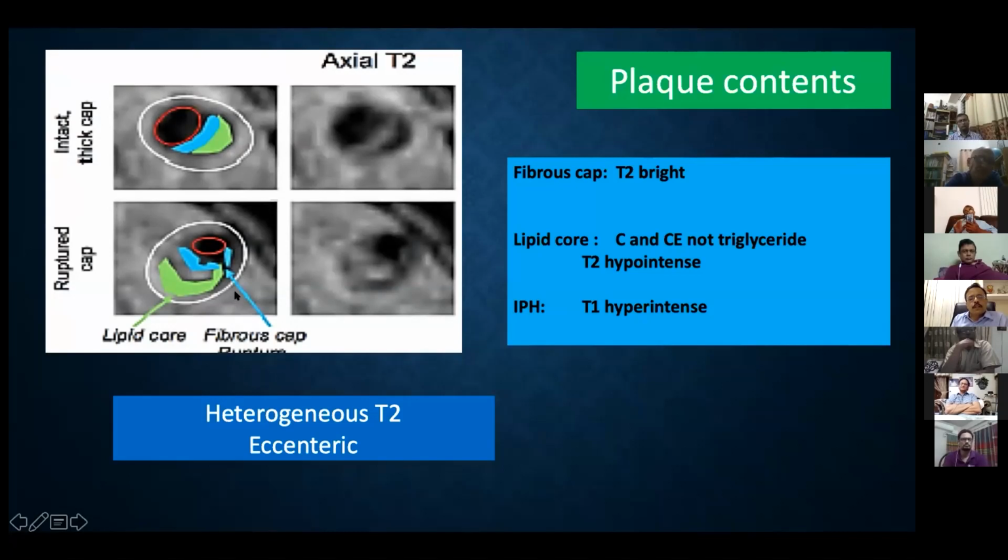While there's another patient like this, this is the lumen, but you can see the fibrous cap seems to be broken in between, like a gap. So we know this is a ruptured plaque in this particular patient. Lumen, fibrous cap, the plaque. In this case, the fibrous cap is broken, and then the plaque is there, and this can really embolize. This is a ruptured plaque.